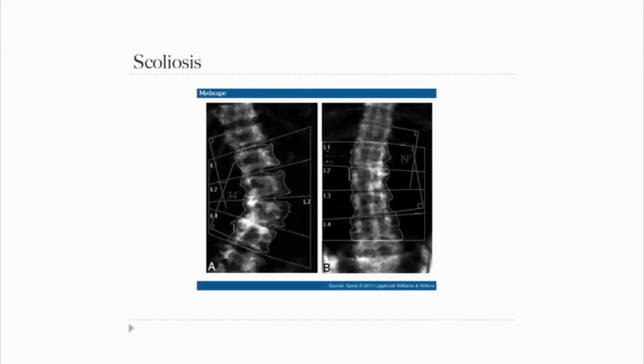The other thing you can learn from a bone density report, which we might not have thought about, is if you have scoliosis or curvature of the spine. You remember that picture of the spine that we saw on the early bone density slides? Well, this is kind of an enlargement of that. And the spine in a healthy state is straight up and down. When you see a spine that is curved, you notice there's some deformity, and usually it's a scoliosis going on. So that's sort of an additional thing you can learn when you look at the bone density test.